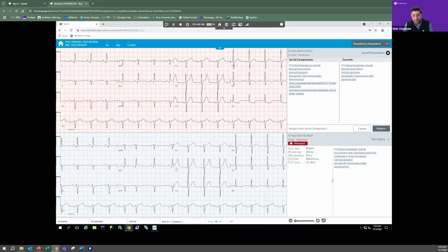Second one says, same ID means same patient, same ID, but typo in demographics. Yeah, so you mean the mismatch. I see what you mean. So I purposefully selected the mismatch.